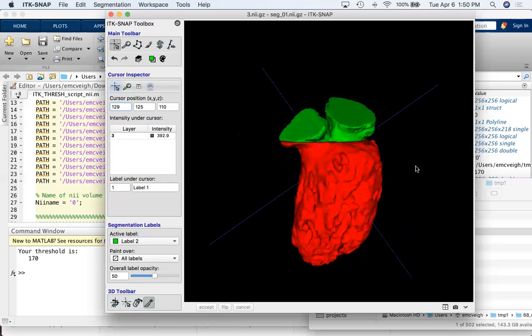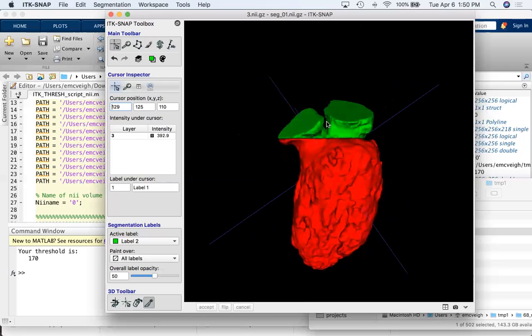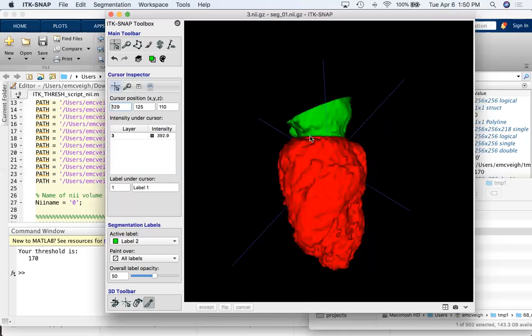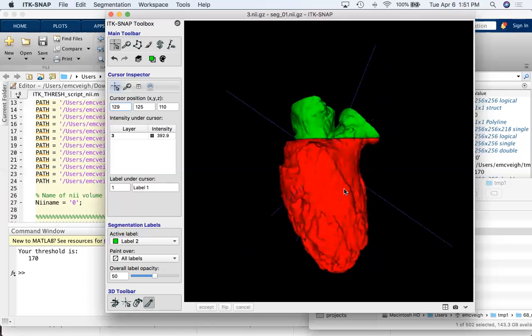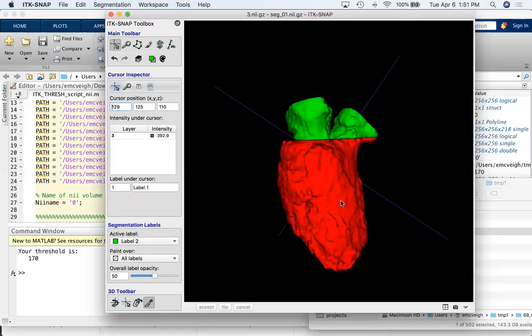Yeah. The other way is to look at it this way, where you have this V. Gabby likes to look at the back. That's another way of doing it. But I think for this heart, this was a pretty good orientation because we got it each way. And so now let's do this.